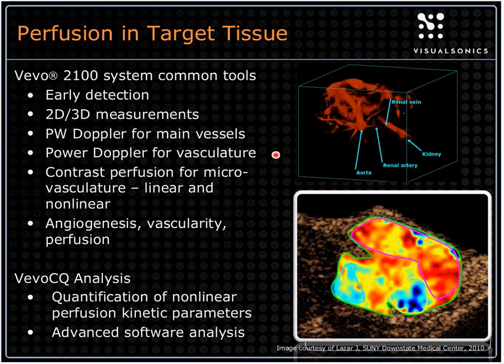Other modes, such as the Doppler modes, are for looking at vasculature and blood flow. We have an example here in the upper right of the slide of a power Doppler, a 3D power Doppler. This shows the vasculature in and around the abdominal aorta, the renal artery.